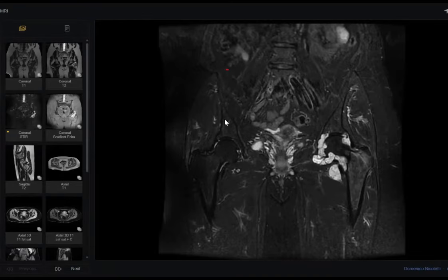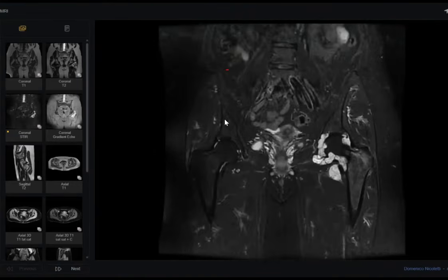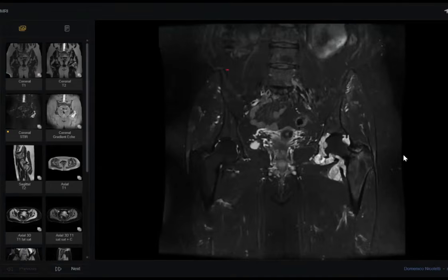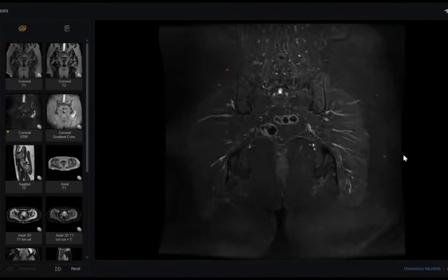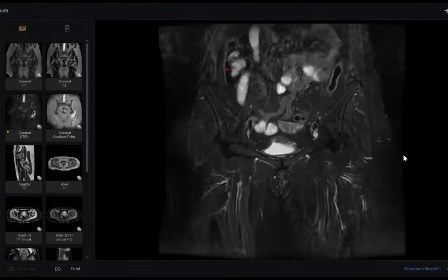What's your differential diagnosis? I have requested it, good luck, and then tell me your differential. These are lobulated hyperintense lesions that appear to be insinuating in between the planes.